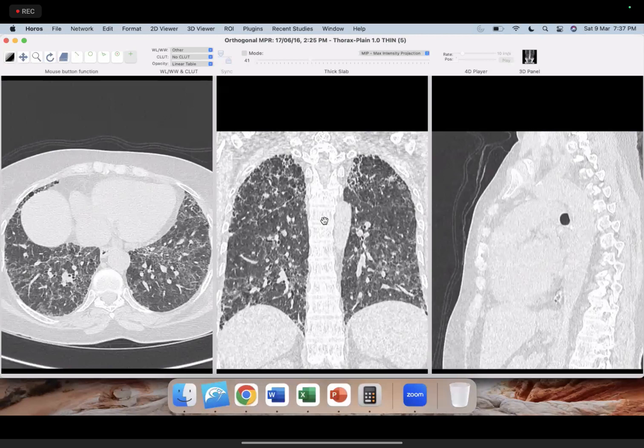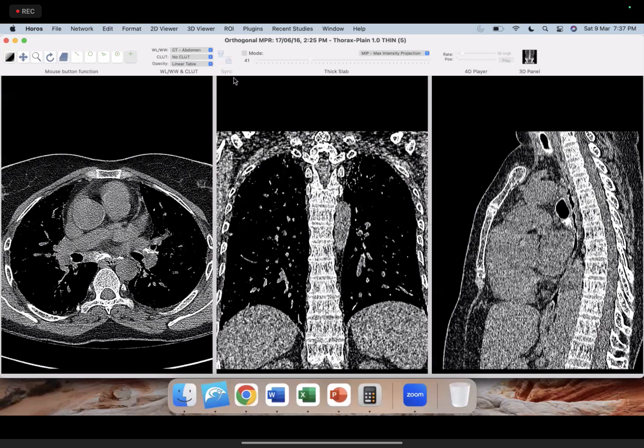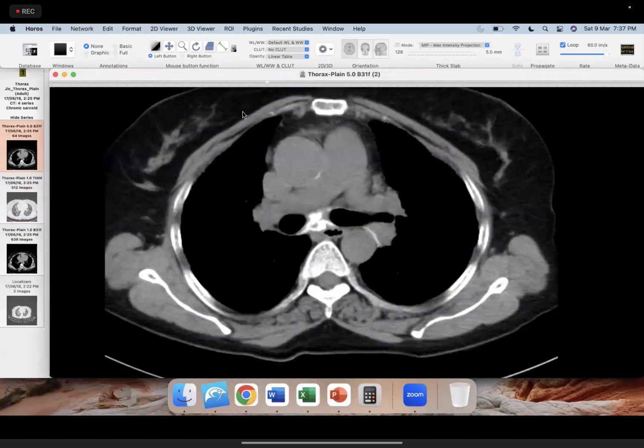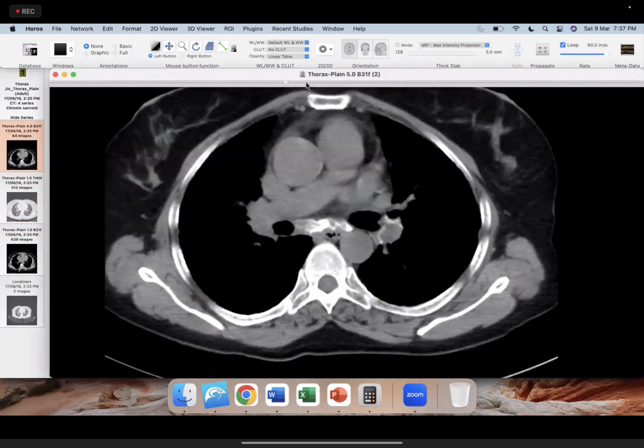What do we see here? I think, yeah, I have a soft tissue window also. You can see, just see the thick sections here. So what do we see here? The lymph nodes are present with this typical pattern of calcification. What is this? Eggshell, right? You see at the periphery of the nodes looking like an eggshell.